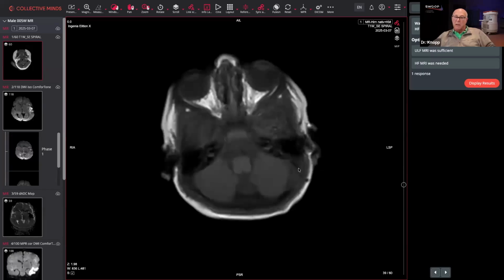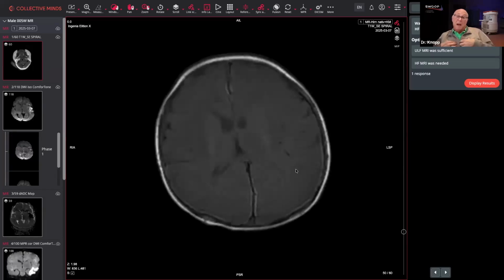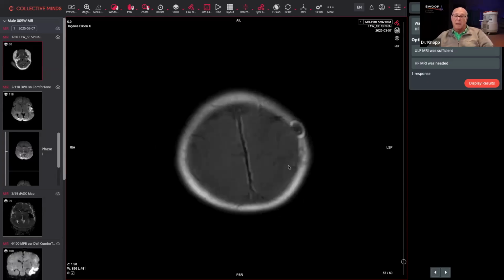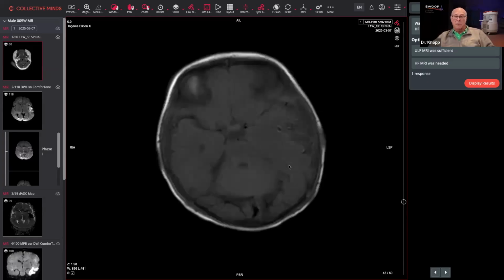the original study. So at least in my mind, from a neuroradiologic standpoint, to answer the acute clinical question, the Hyperfine provided similar information, as did the high field, albeit the high field had, obviously, a significant increased resolution. Hemant, anything to add?